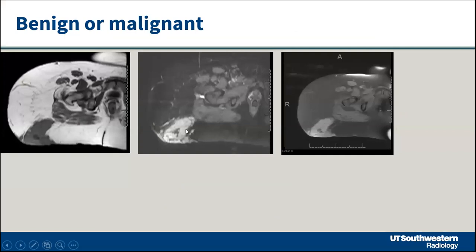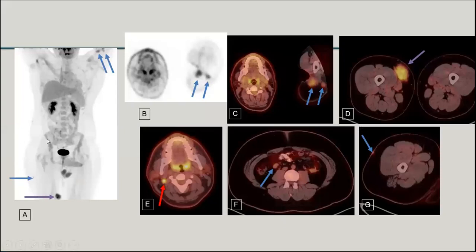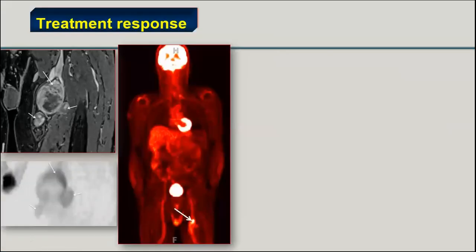Here, is it benign or malignant? Well, hard to tell. It's an enhancing, solid indeterminate lesion. Look at the ADC, it's dark. That's worrisome. It turns out this patient had more lesions in other places. So this is Rosai-Dorfman syndrome. Okay, again, it's a lymphoproliferative or histiocytic proliferative disorder. They basically can give you low ADCs. So it's hard to tell, is it really bad stuff or good stuff?